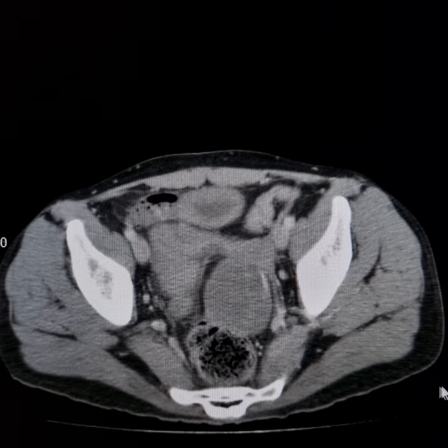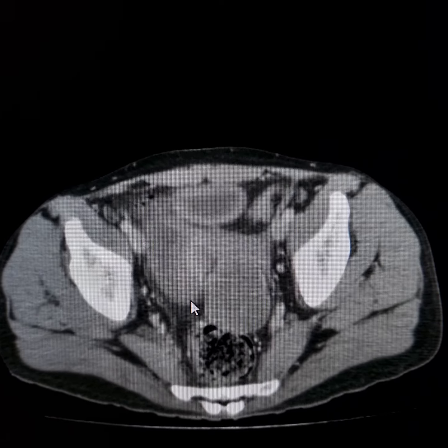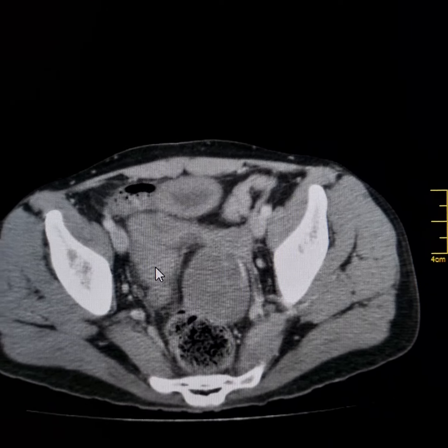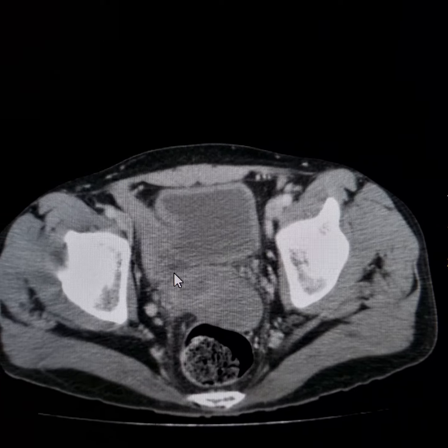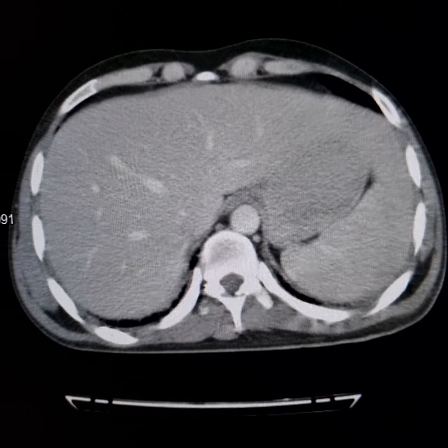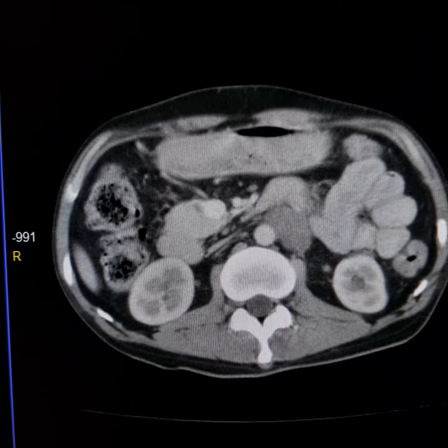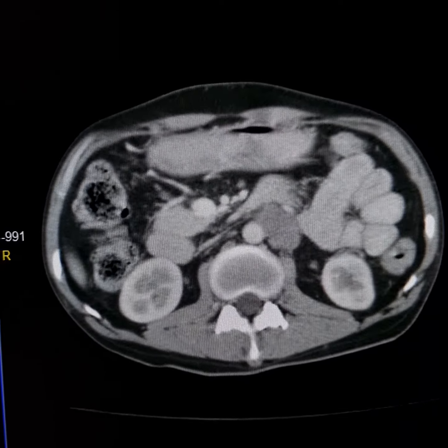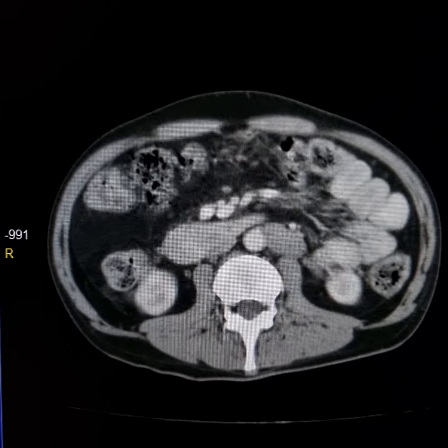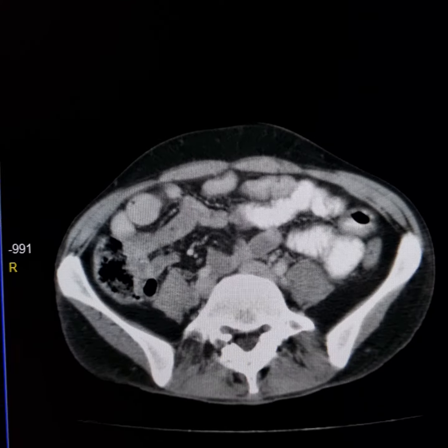Now since the size of the growth has reduced, it appears to have expanded because of non-compression by the pelvic tumorous left testis. So it is my humble advice that in any investigation which is provided to us, we must first go into the details of the history. If not provided, then we must look very carefully into each and every corner of the investigation to collect the information.